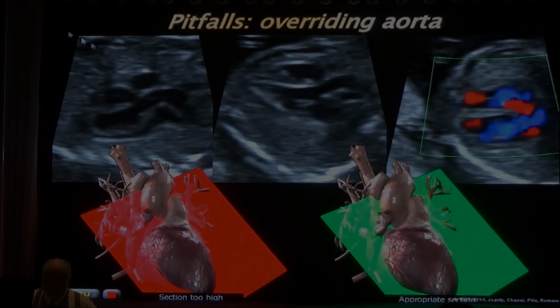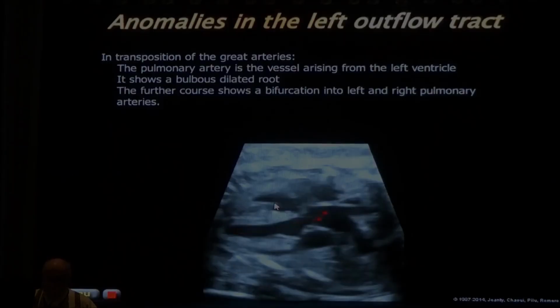So be careful about that, because this gives you a lot of false ventricular defects. This is a common reason for overreading them, and you have to do Doppler on this image to make sure that this is correct or not. So be careful with this image.